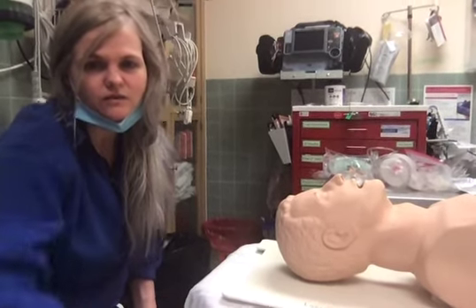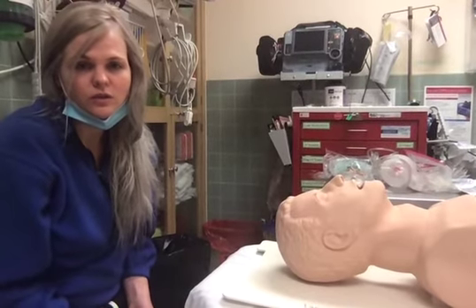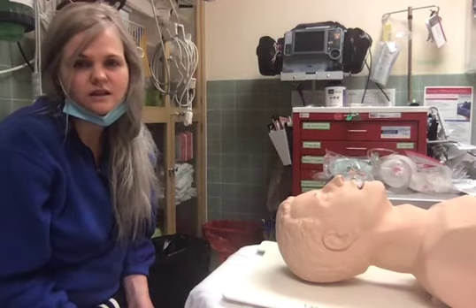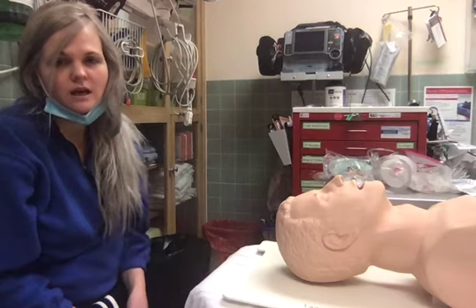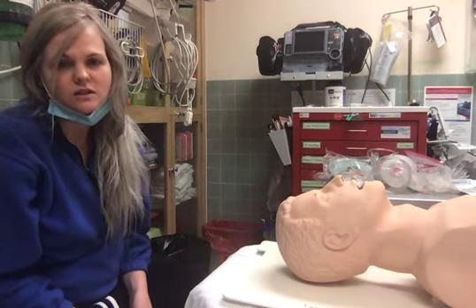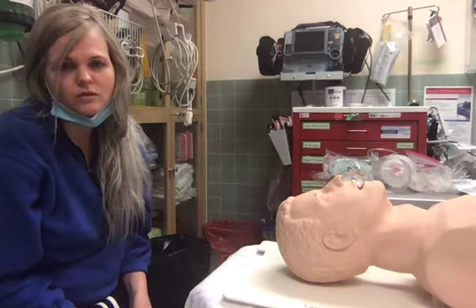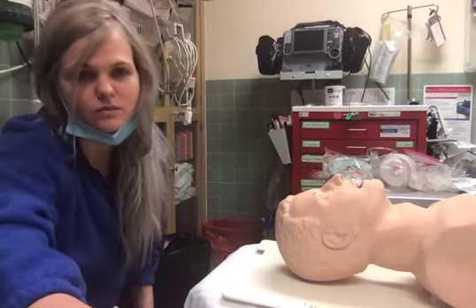My objectives for this course are that the EMS student will be able to verbally identify airway adjuncts utilized in deteriorating patients in the field upon visual request. EMS students will then be able to verbally identify one indication for each airway management strategy, and will also be able to verbally describe one contraindication for each airway management strategy described in this presentation.